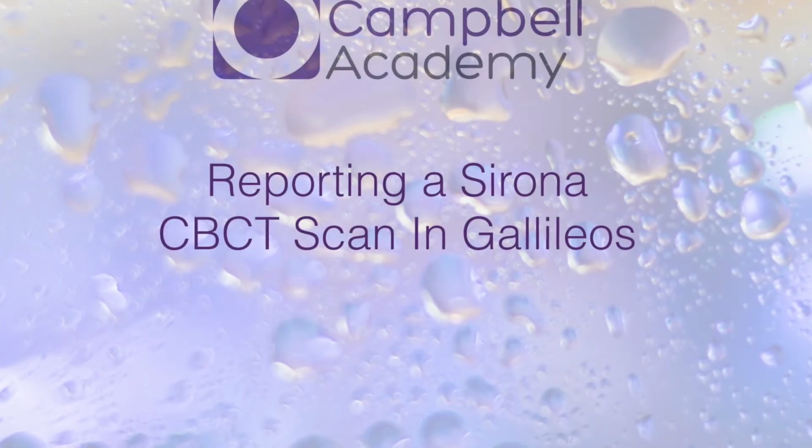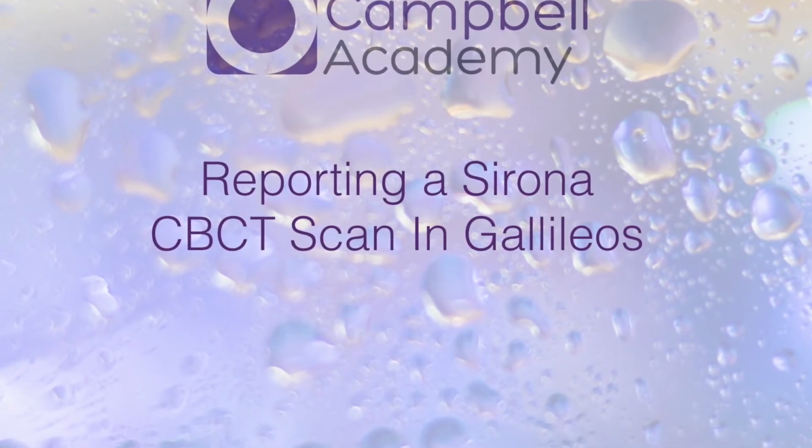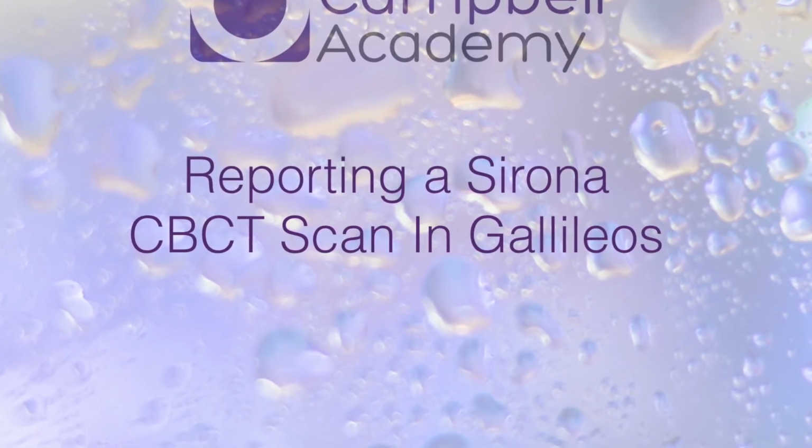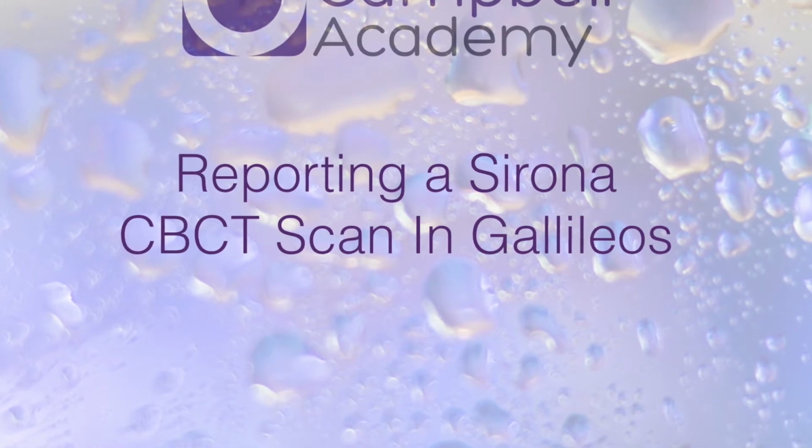Hi guys, welcome to reporting a Sirona CBCT scan in Galileos, part of the Galileos software from Sirona. This video is just designed to show you how to open the files and to help you to report them.